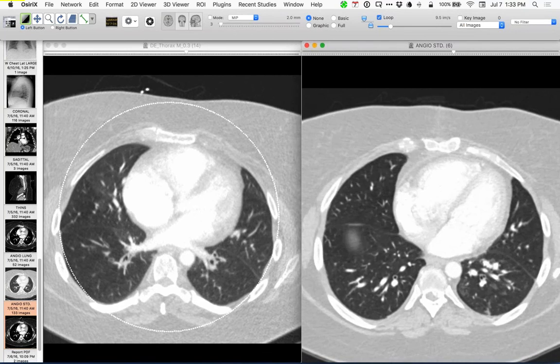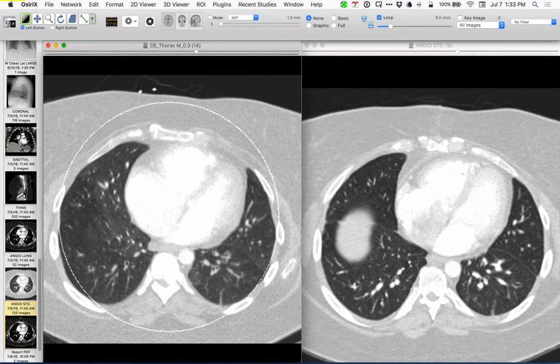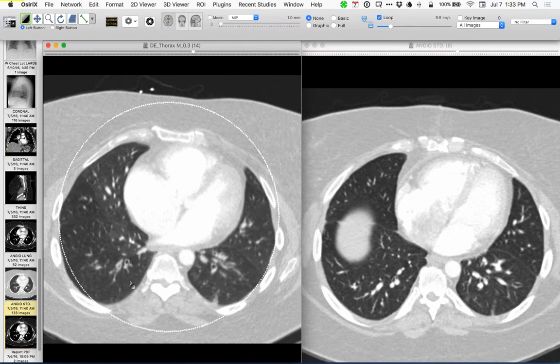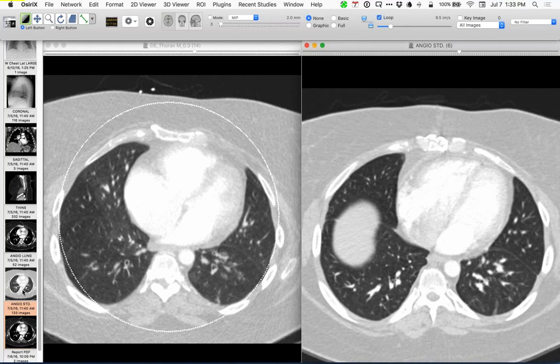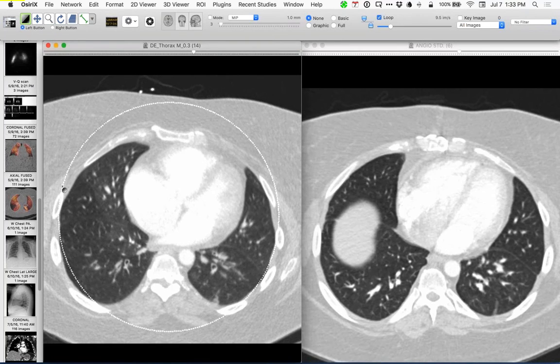And also, Howard, I was thinking when you're showing the first CT, and you can see in those lower lobes how you have a little bit of bronchial dilatation in the areas of mosaic perfusion, which is a well-described finding in chronic thromboembolic disease. Yeah. And that looks like it's gotten better too. But the bronchiectasis or bronchial dilatation is one of those things I always read about, but never really understood why it happens in chronic thromboembolic disease. Yeah. But it's well described, and it's also a potential pitfall if people see that and then just attribute the mosaic perfusion to small airways disease, assuming that it's related. Yeah. But I have no idea why that would get better. But I guess I don't know why it happens in the first place.